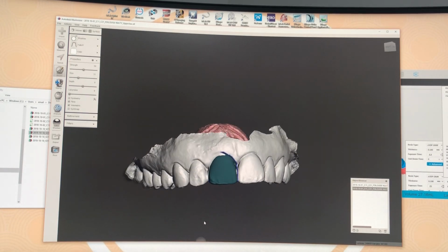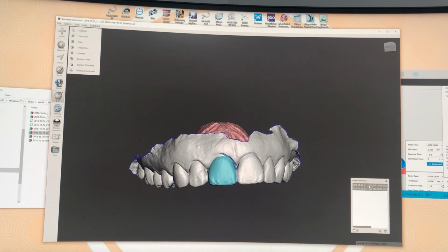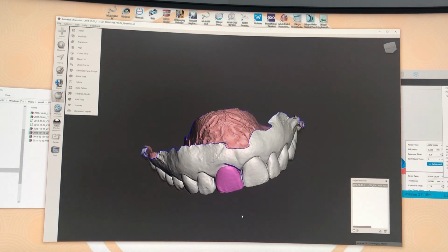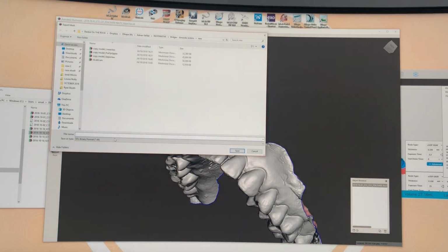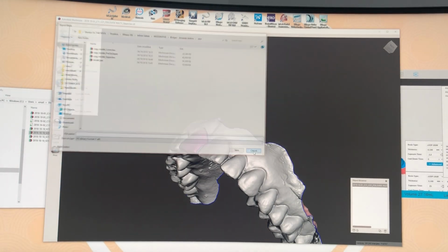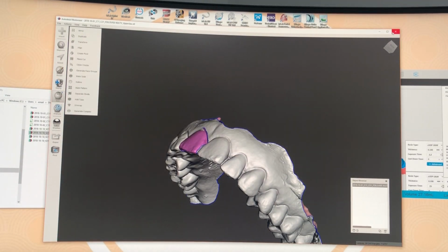So now what we do, we'll go down here, click on one, hold Shift, click the other, and then you see up here, click Combine. So combine, and hey presto, we've got one model again, yay. So now that's all one model that we can File, Export, and call it whatever we like. Done. Okay guys, there you go.